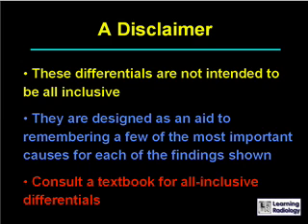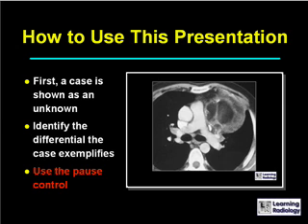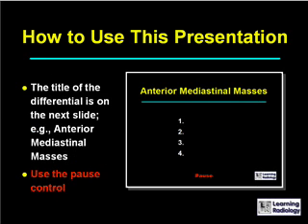Remember, these differentials are not intended to be all-inclusive. They're designed simply as an aid to remembering a few of the most important causes for each of the findings shown. The way the presentation works is a case will be shown first as an example of the differential to follow. Use the pause control on your computer or MP3 player.